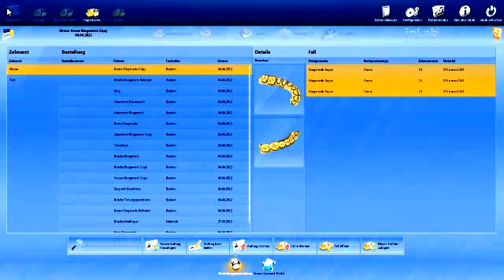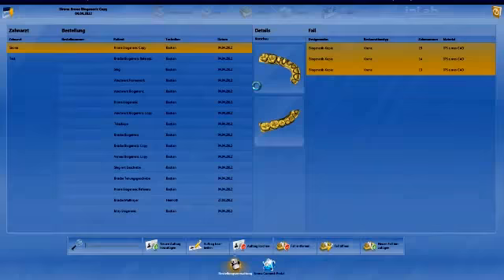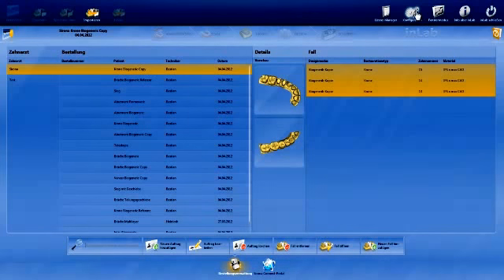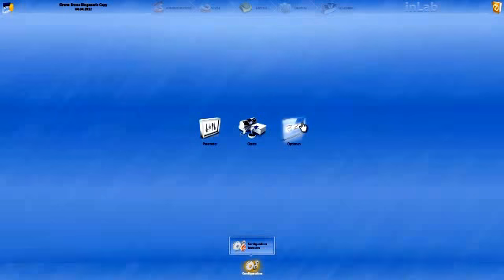I activate the System menu on the top left. In this menu, I can save the cases, also under a new name, as well as import and export cases. I am also able to open my License Manager in order to display my USB stick status. Furthermore, I can define the new options of my software under Configuration.